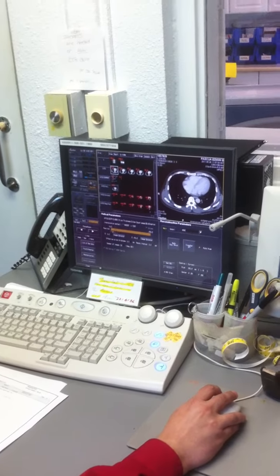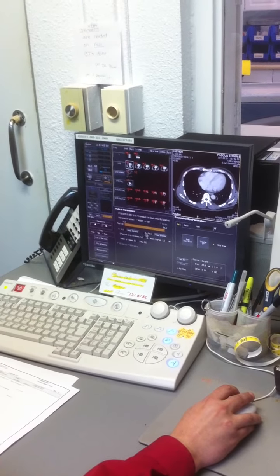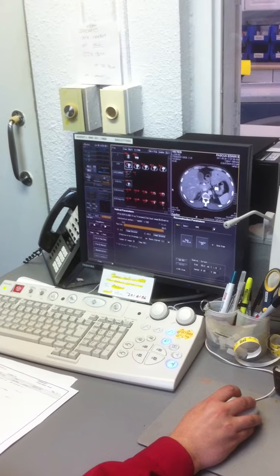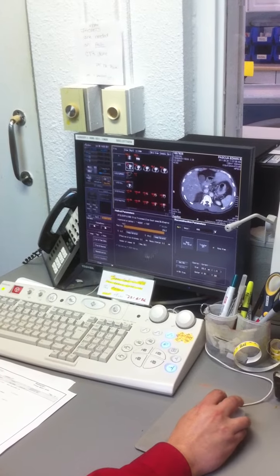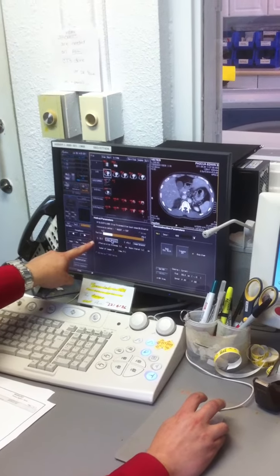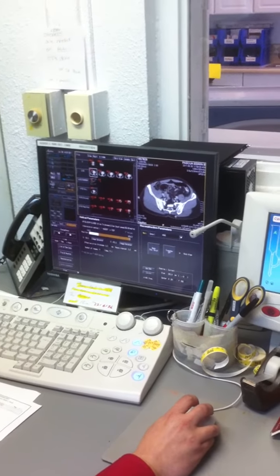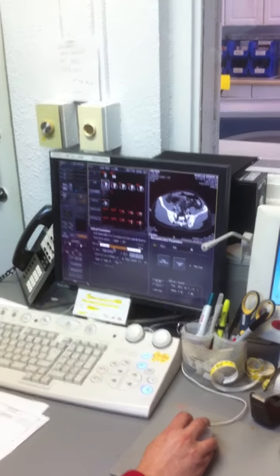This represents your raw data. Start and end, right? I'm going to do that right now. I'm going to go to the last rib. And rather than typing in this number here, I'm just going to hit image selector here, right next to S. You see that? I'm going to end right there. So now I've come in on the raw data where I want to be.